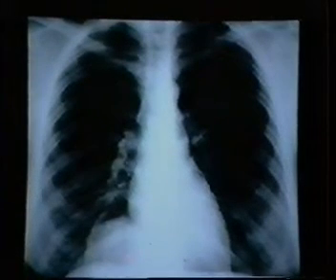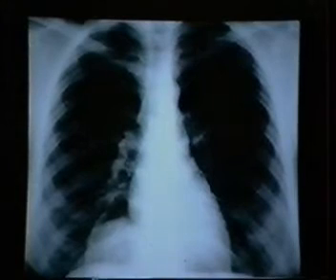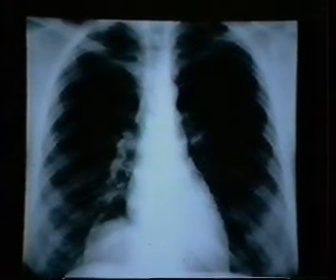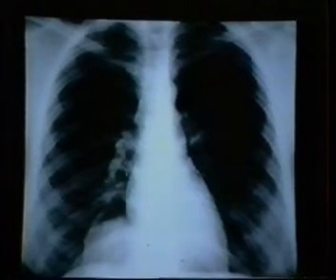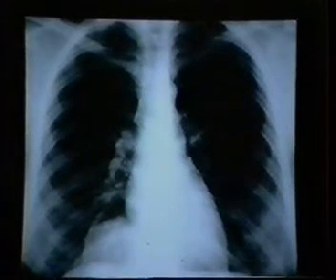So, for example, an anterior mediastinal mass tends to obliterate the margin of the heart, as this one is doing, or perhaps the ascending aorta, or perhaps the superior vena cava, all anterior structures. If a middle to posterior mediastinal mass is situated in about this region, it may well silhouette the aortic knob. And finally, posterior mediastinal masses tend to obliterate the outline of either the paraspinal line or the descending aorta, depending on exactly where they're located.